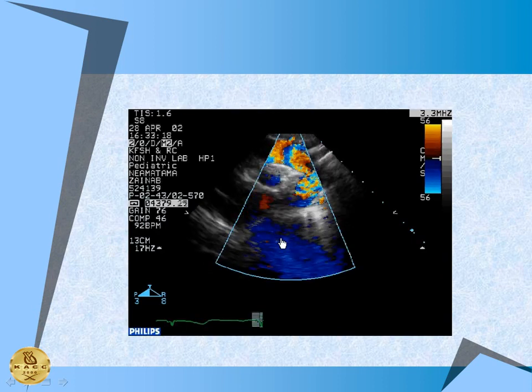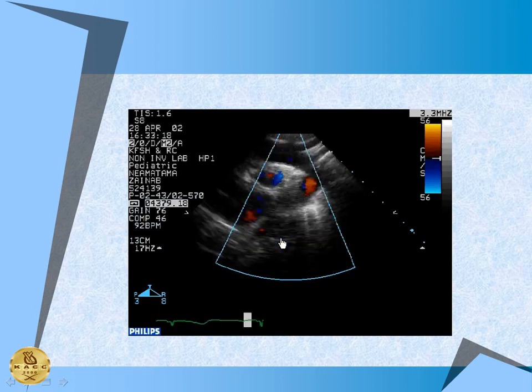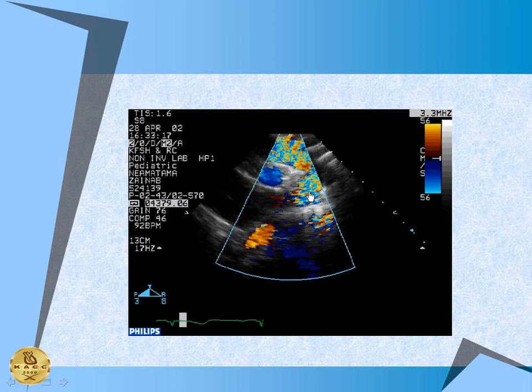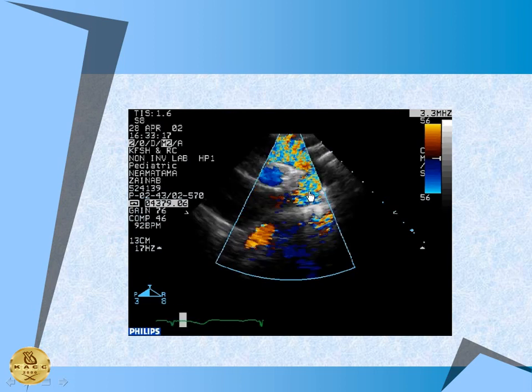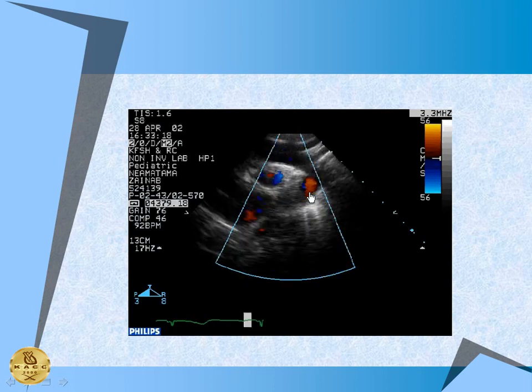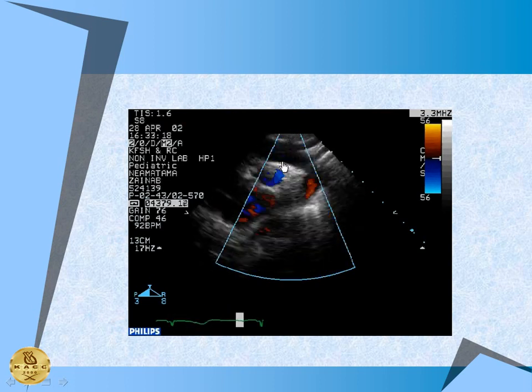And what is this? Is this coarctation or is it something else? Who's a taker? You think it's coarctation? The flow here is turbulent, isn't it? It's quite turbulent. Is it coarctation? Coarctation, raise up your hand. Not coarctation, don't raise up your hand. So you all say it's not a coarctation, or you don't want an answer actually. Actually, this is not a coarctation.